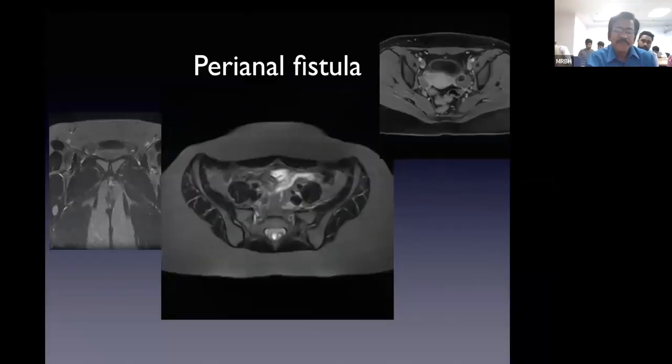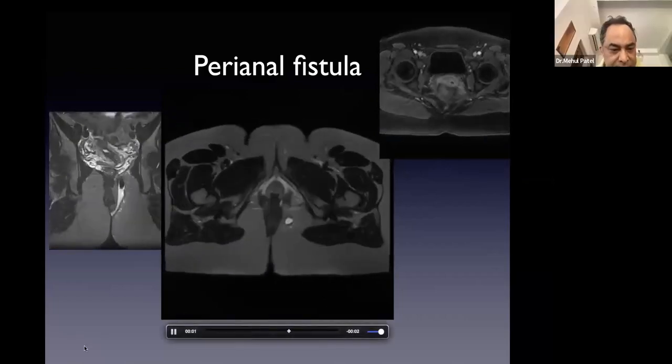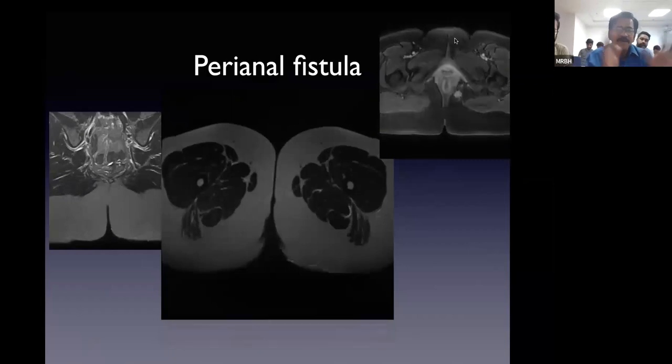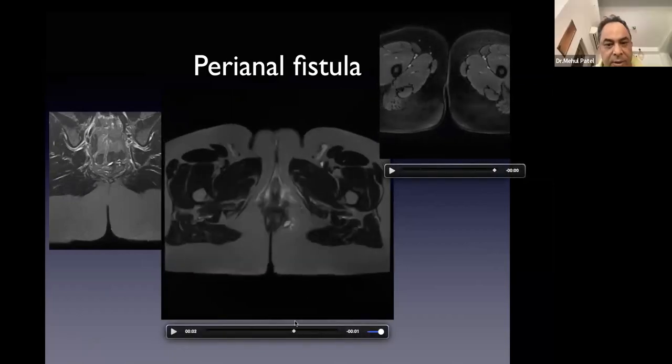Okay. Rajudri, previous picture. Can you show us the lateral structures? What are the normal lateral structures you are identifying? Just anatomy in the MR. Okay. Yeah. Just beyond the rectum. What are the adjacent structures you can identify?